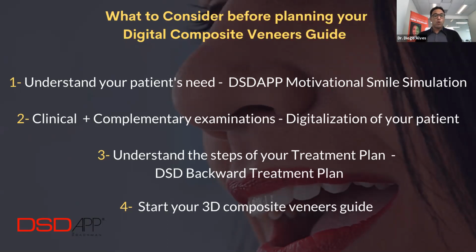And then of course, once you understand what the patient wants, once you know exactly what he or she needs and desires, you then take this patient to the clinical room so you can take the complementary examination. So you digitalize your patient. You add all of these documents, such as x-rays, intraoral scans, or other photos, into the app as well. And that will help you organize yourself. It will help you create this digital patient in order for you to use it as a tool for your treatment plan.